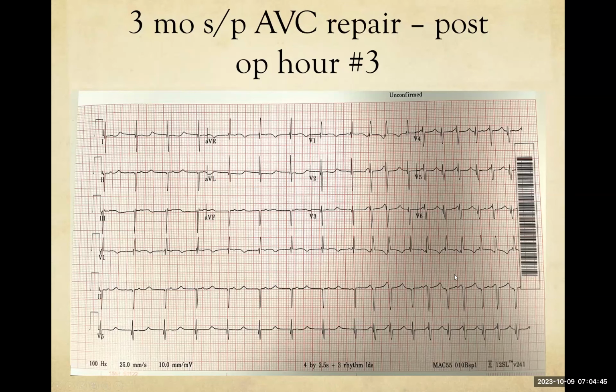Are they the same thing, or versions of the same thing? I think they may be different versions of the same thing, with the beginning appearing maybe to be like a junctional, and then becoming more like junctional, like JET towards the end, versus VT at the end. Mm-hmm. I would like to do an atrial electrogram to further confirm that, but you can kind of see the P waves there too. But right, so you don't really need the atrial electrogram, right? Because you kind of figured it out without it. So yeah, I agree, that was outstanding.